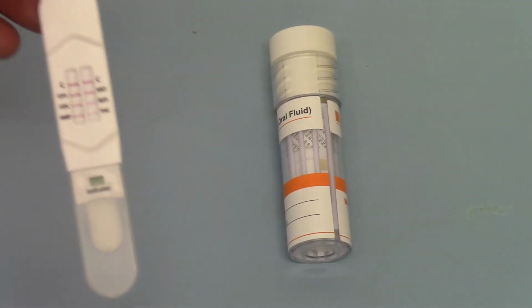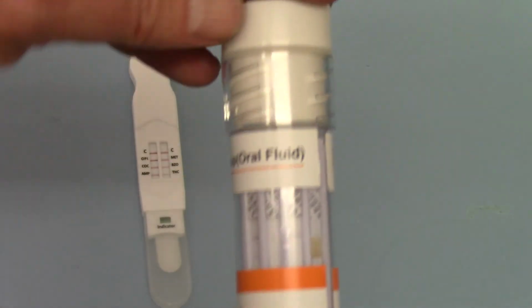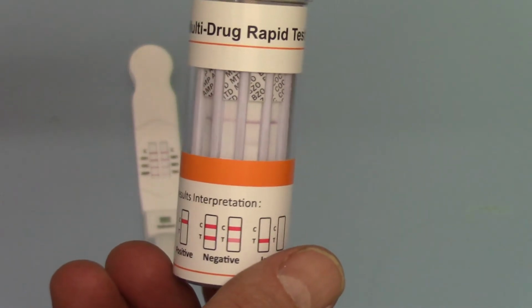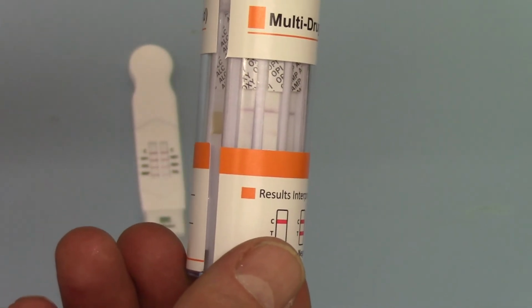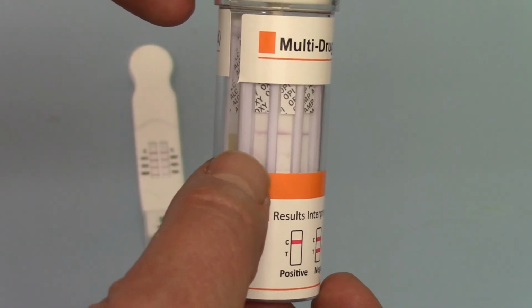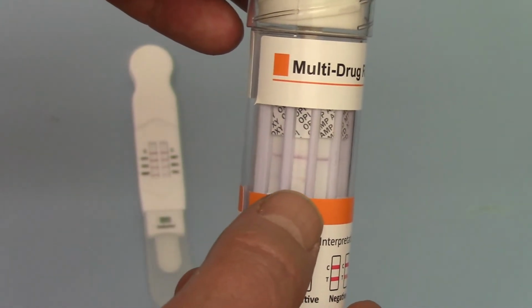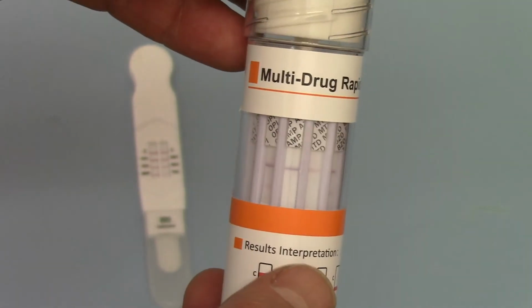Now what we're going to move to now is this comparative test, which is made by the same manufacturer, contains the same combination more or less of membranes, and you'll see here that there's quite a bit of variation, and some lines are extremely thin and faint. So the oxycodone test membrane here, very faint line in presence of a control line. The OPI, a very faint line, test line there with a control line.